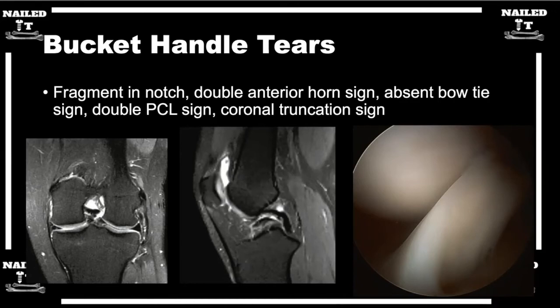You're also, as a corollary to that, as you get out toward the periphery, going to see an absence of tissue in the periphery because that tissue is no longer sitting where it's supposed to. It's sitting in the notch. So you're going to see a smaller triangle out in the periphery because tissue is not there where you expect it. Right. So kind of like right here, we should expect a little bit more black signal here, but we have that increased white fluid there, and our meniscus is flipped over into the notch right here, which is this black line. That's right.